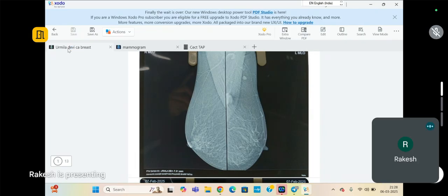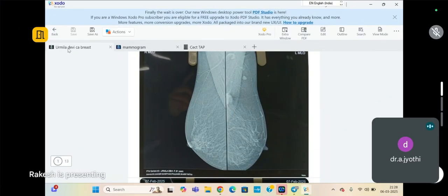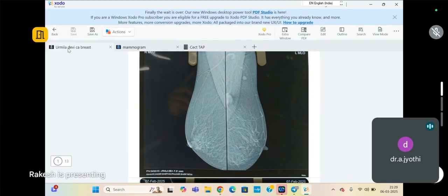Okay. So how do you see a metastatic lymph node on an ultrasound? On ultrasound, it will be taller than wider, thick cortex. Lymph node. Okay. Not the lesion. Why is it taller than wider? Generally, nodes are round when they are. No. Taller than wider is the lesion, not the node. Okay. Why is it taller than wider?